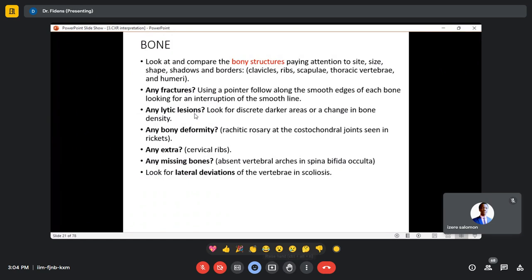You see, it can be caused by different diseases. Okay, different diseases. Yeah. But the appearance is darker than normal at that area. So it can be a bone cyst, can be an abscess, can be anything. Okay.